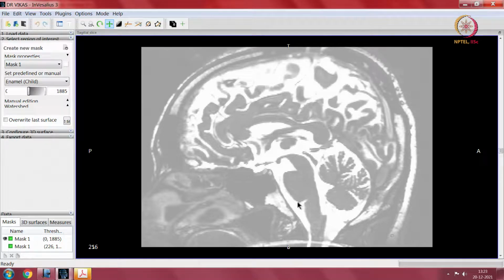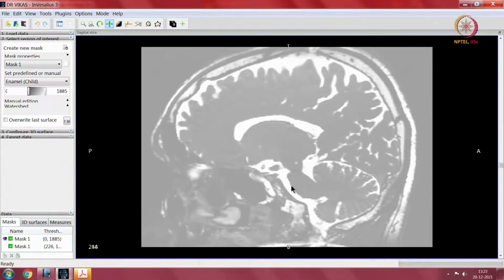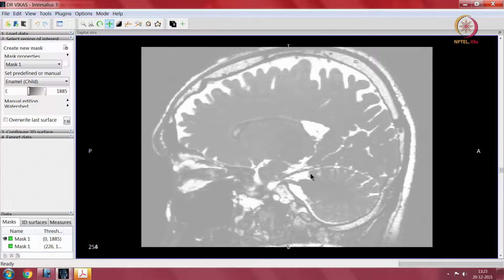You can distinctly see the pons separate from the medulla. Part of the upper part of the medulla forms the fourth ventricle. The fourth ventricle is somewhere up to here. This would be the obex. So, half of the medulla is part of the fourth ventricle, and the half of the medulla down is not part of the fourth ventricle and continues down as the spinal cord. This would be the pyramid, and this would be the cerebral peduncle. This is the mammillary body. So, that is it. I think that is a very elaborate description of the imaging features of the human brain.